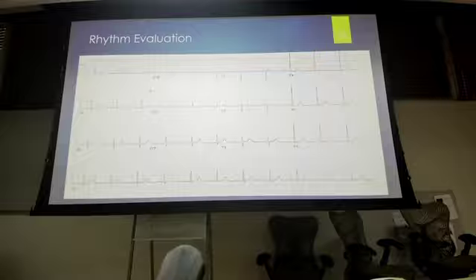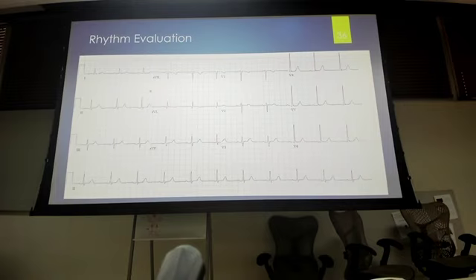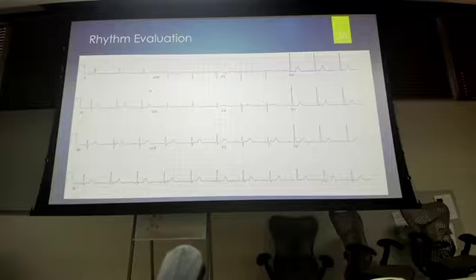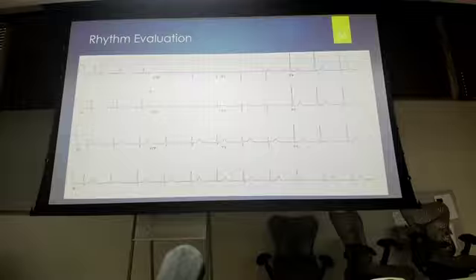Willis. Where you at, Willis? Oh, Gary. Okay, sir. What do you think the rate is for this? You're like, oh, I can do that one. I said rate. Yeah, 66.